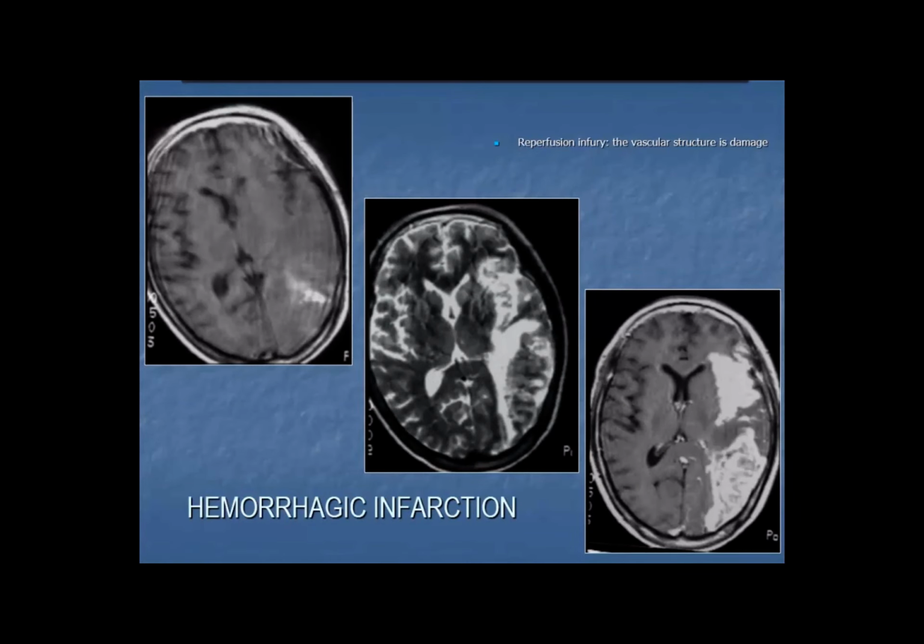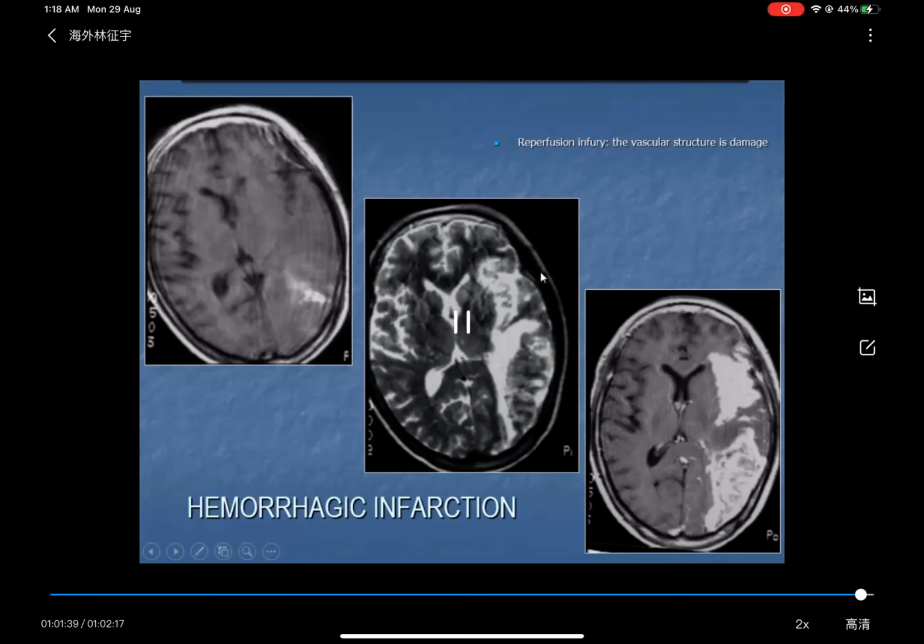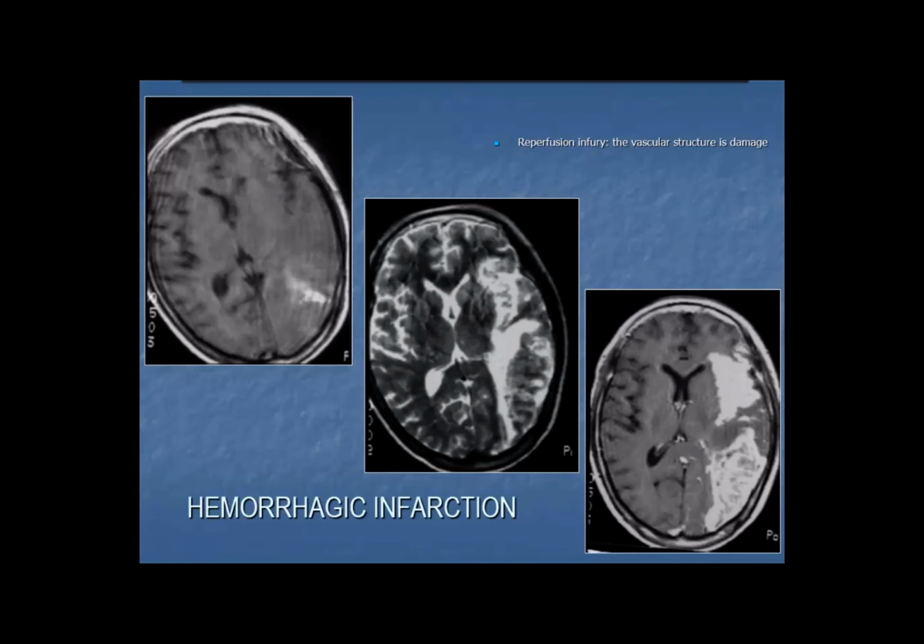This is hemorrhagic infarction. The cause is reperfusion injury. The vascular structure is damaged, so we can find some hemorrhage in the infarction area.